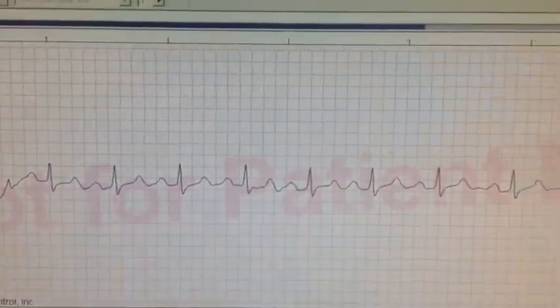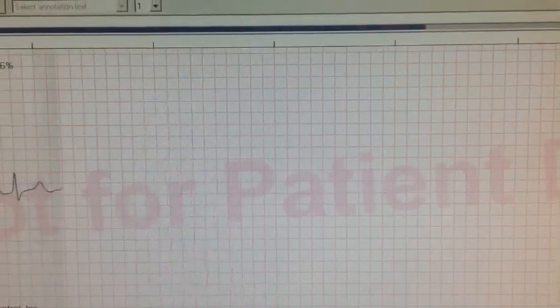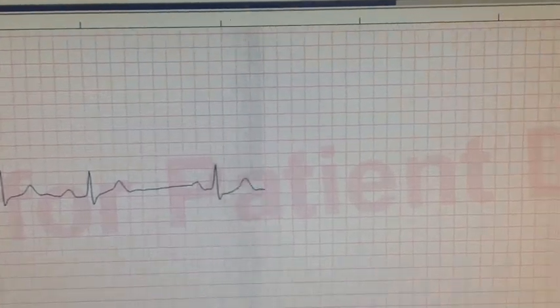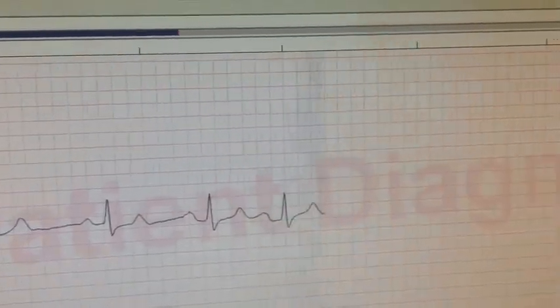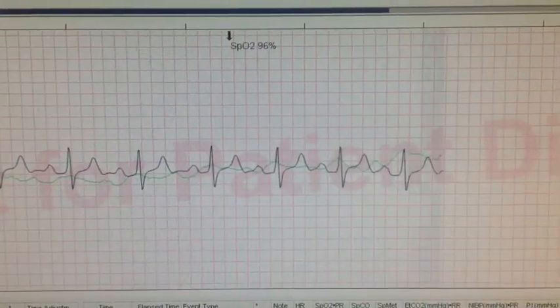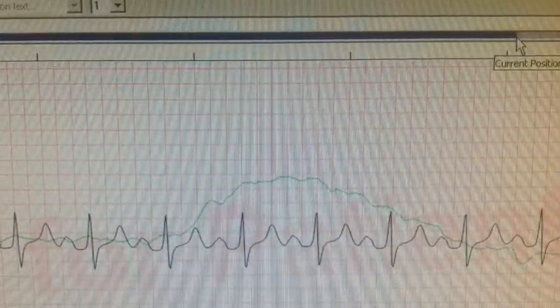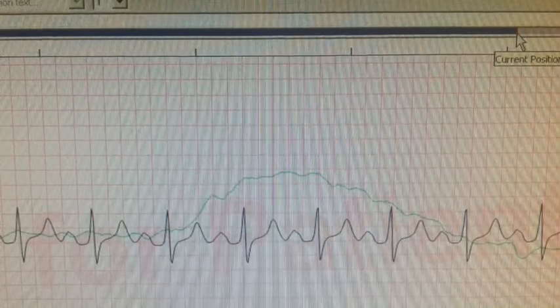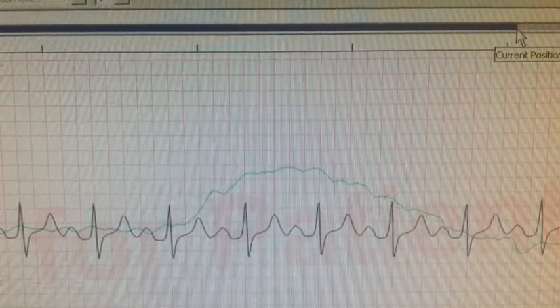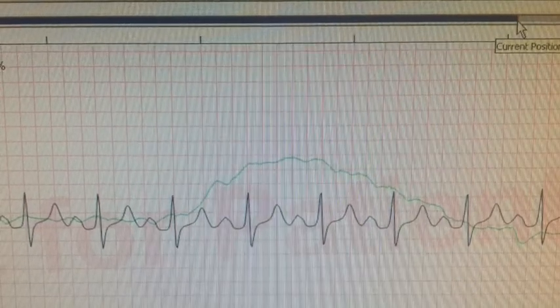Throughout my career, this is what I've been accustomed to when I look at an EKG strip. It's static. It shows me the P wave, the QRS complex, the T wave. It shows me the internal electrical components of the heart. But when I overlay the impedance channel, you can see that green line, bloop. See that? That's a ventilation. That's chest wall movement with the chest rising. Here again, in a still shot coming off the isoelectric line, you can see this is a bag valve mask ventilation, probably in the neighborhood of 500 mLs.